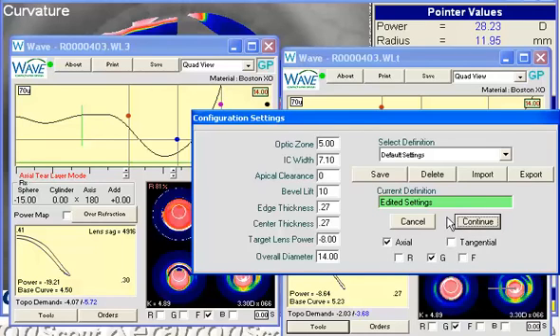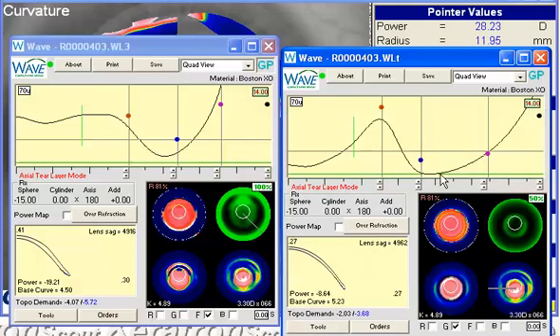So with that said, I went through and designed this lens. I'm just going to cancel it here since I already designed it. Using that 8-point step, I just followed all the steps, and you'll see that we got a lens now that is a little bit more aligned. I'm assuming we got a little bit better data now in the superior and inferior area, and this lens I would anticipate would probably center a little bit more nicely for you, or not necessarily center more nicely, but align more nicely in that cornea.